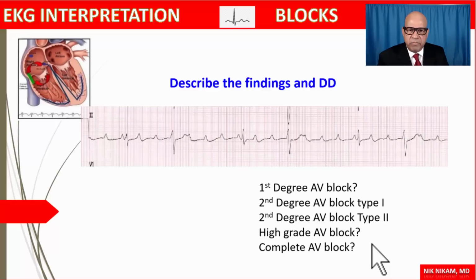If it is complete heart block, we should see AV dissociation where none of the P waves are conducted to the ventricles. Here we have one rhythm where the QRS complexes are different, and here we have another type of QRS complexes which appears to be a fusion beat. So this is an example of a high grade AV block. This is how you try to arrive at a diagnosis, by excluding the other choices in the multiple choice questions.